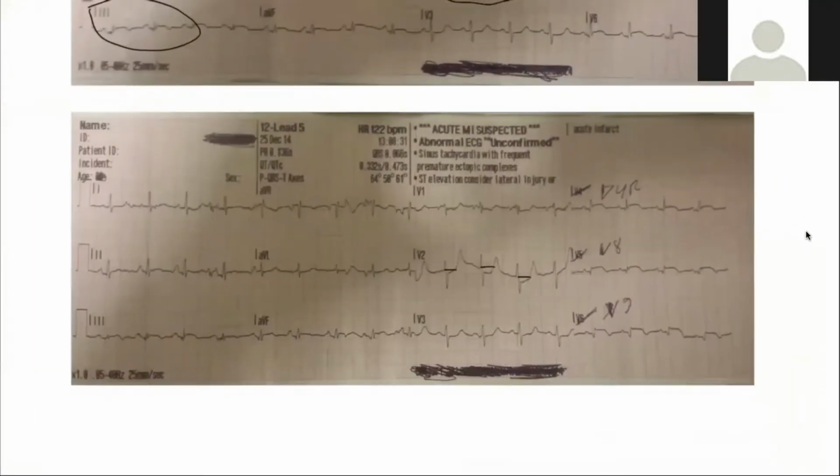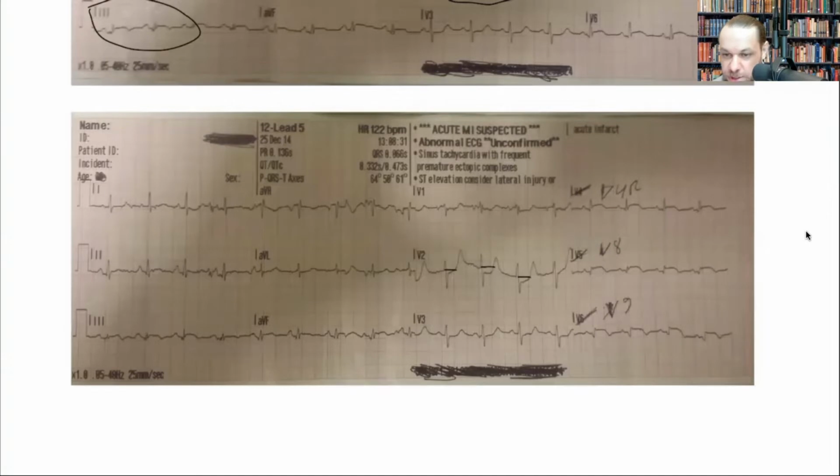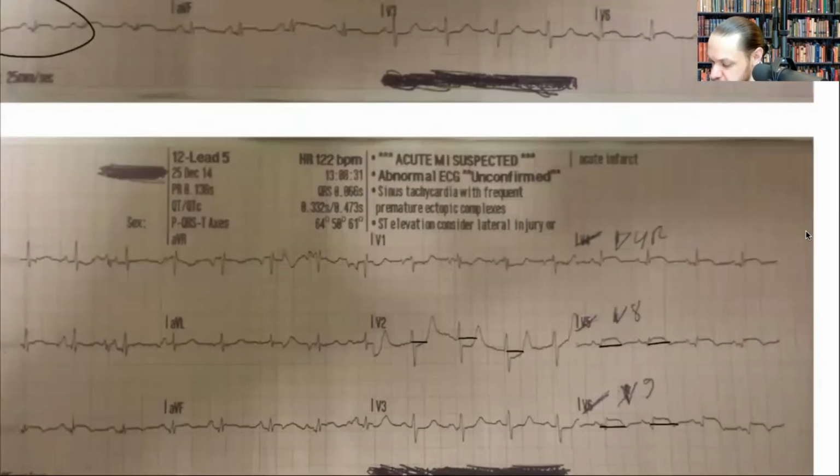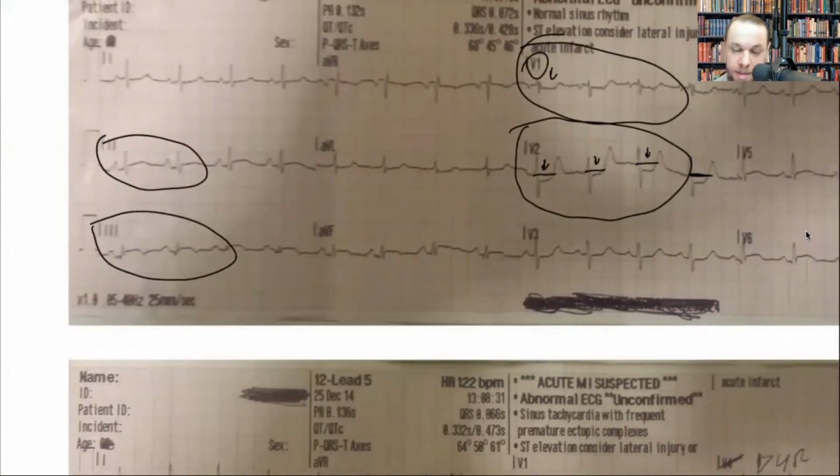Okay, so I was just wondering, how is it depression, and then you see a quick elevation, then it goes back to depression. Yeah, right, so these are precordial leads. You see some movement, but the point here is this is the elevation, right? And then you saw elevations here, but they were not as prominent. They were subtle, but we still caught that here, right?